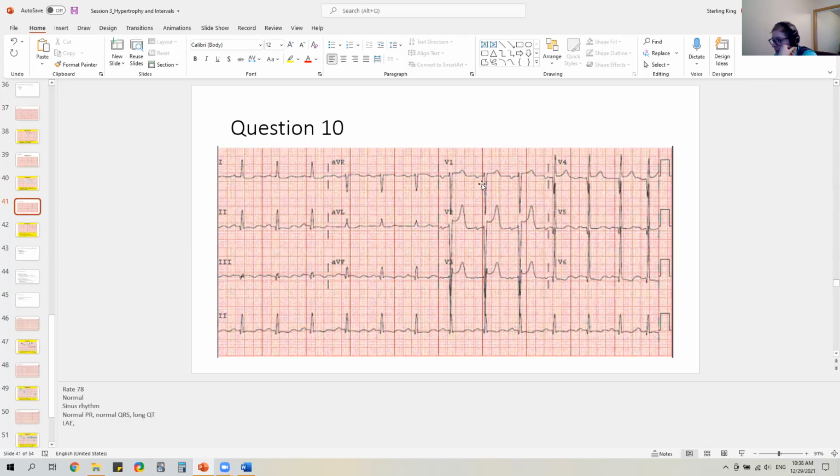And then how about the ventricles? Oh yeah, look at this guy. Looking at the left ventricle, you go 1, 2, 3, 4, 5, 6, at least 6. And if I just look at V2, this is obviously huge. 1, 2, 3, 4, 5, 6, 7. Yeah, I'm well over the 7 boxes. So left ventricular hypertrophy for sure. Great. Okay, so now we're on to the bundle branch blocks. And the QRS was normal, so I don't think there are any bundle branch blocks here to look at.